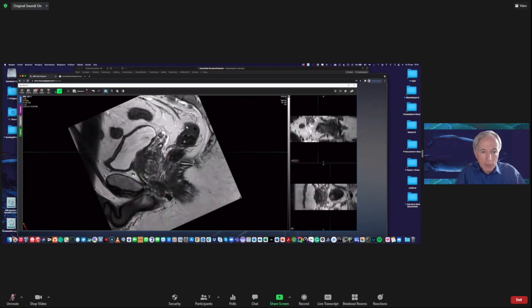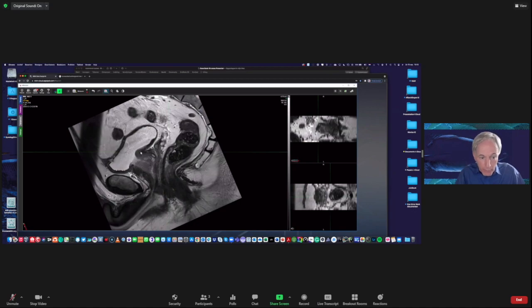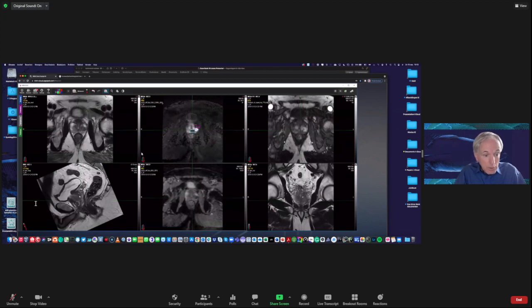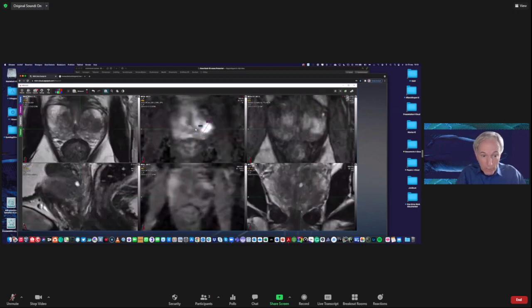And this is a positive lymph node. It's too large. So this is very important to see, because now you see a PI-RADS 5 tumor with a possible positive lymph node. And there is something else, is that if you see one lesion, try to find other lesions as well. So let's make the journey by the B1400. I go upwards.